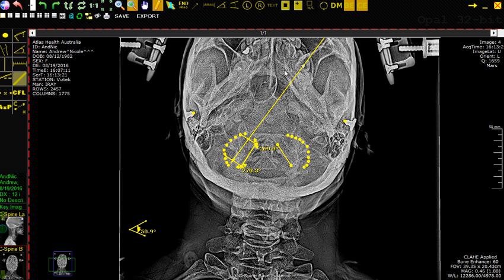Now, before I finish things up here, I'm going to show a secondary way that I've been doing these annotations, but it looks messy. What I use has been the horizontal orthogonal angle tool, and what I will do is put a dot on anterior 1, and then it automatically creates this line that will be 90 degrees to it. And so I will just drag it out until posterior point 1 here. The representation of anterior point 1 would be right there where this line is going to intersect at the margin that we outlined before.